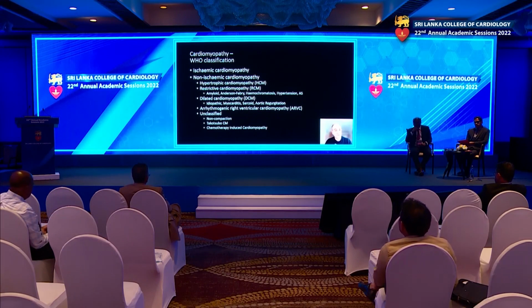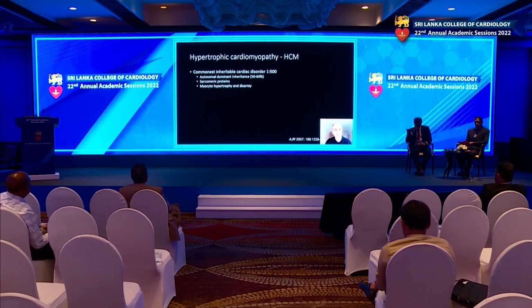And because of the time restraints, what I hope to do is run through most, but not all of these conditions and show how we use MRI to help us investigate these conditions. So we're going to start with hypertrophic cardiomyopathy.